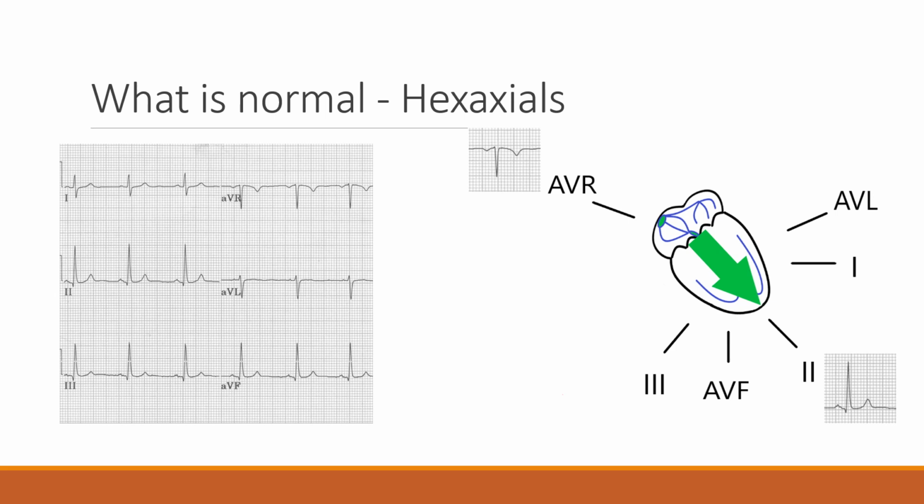And I see a lot of providers, they send an EKG to me, or they come into the hospital, or vice versa, and their interpretation is that it's a perfectly normal EKG, and then I see all these abnormalities on here, some of which can be concerning and even life-threatening. And so this is very important to master this part here.